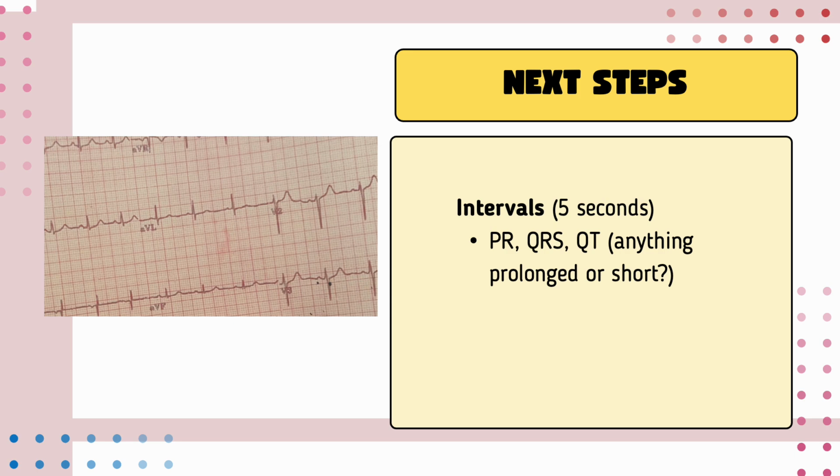And what is the QT interval? Again, the QT interval has most likely been done for you at the top of the ECG sheet. It comes with most ECG machines now, and all you have to do is check the value. Otherwise, you may start measuring this.